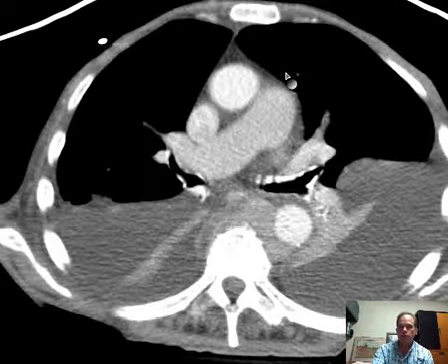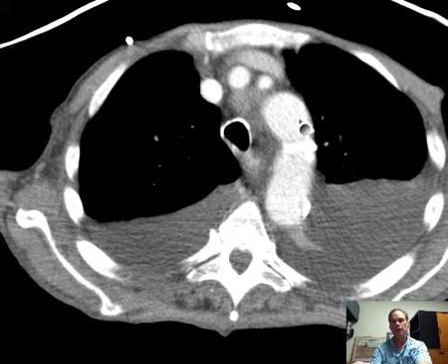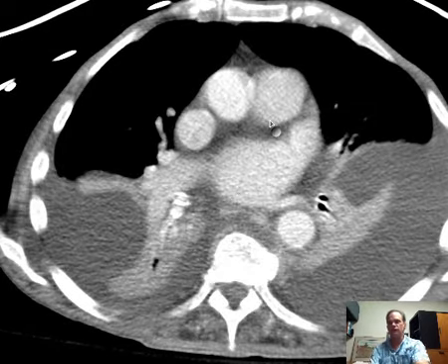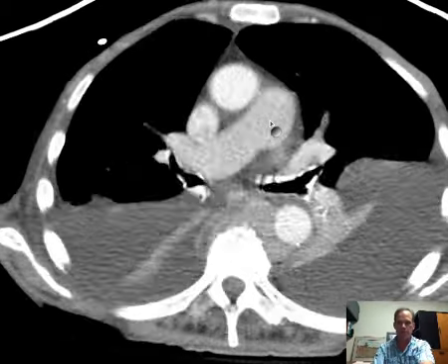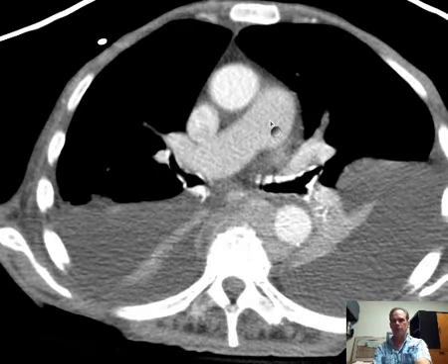Now, most people learn the aorta and the pulmonary artery. They learn the aorta first because everyone knows the aorta because it's a nice little bump on the chest radiograph. And then you kind of have a general vague idea of the pulmonary artery. But the relationship of those two arteries is very important. Everybody understands the aorta. Very few people, or relatively few people, really have a full appreciation of the pulmonary artery and the right and left main pulmonary arteries.